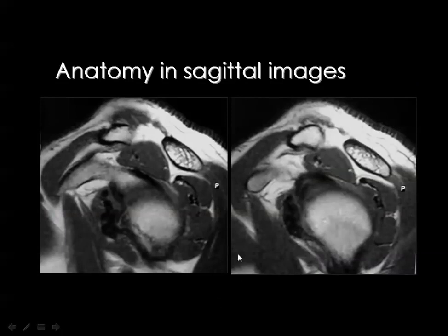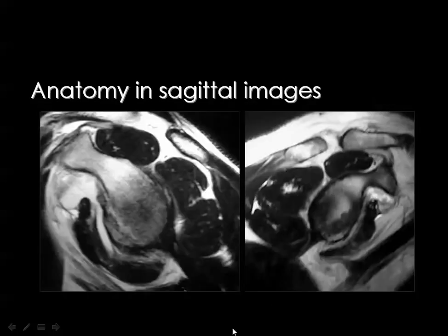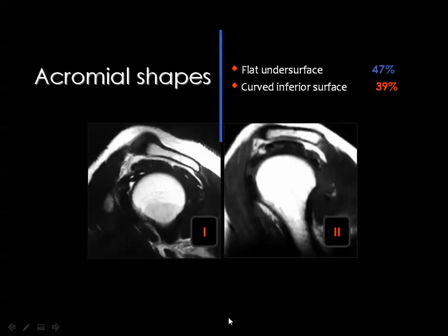Then these are sagittal images, and this is the coracoid process, supraspinatus, infraspinatus, teres minor, and the subscapularis is located anteriorly. Once more, this is the acromioclavicular joint, supraspinatus, infraspinatus, teres minor, and the subscapularis, and here's the coracoid process. Then this will be the clavicle, and this will be the coracoid, the acromion, the clavicle and the acromion. One of the important values of the sagittal images is to evaluate the shape of the acromion, and we have 4 shapes for the acromion.